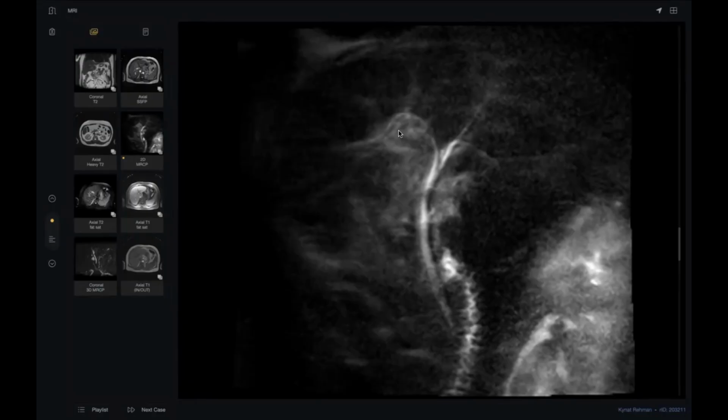Sir, because there are biliary channels, so there is delayed excretion in the cholangios. First, the liver will take up the contrast, and then. Okay, but because it is hypovascular, very easy. Yes, sir. Hypovascular. Any hypovascular lesion. And I think in cholangiocarcinoma, when it causes retraction, it indicates that it has some fibrous stroma. Overall, the cholangiocarcinoma is hypovascular, at least in relation to the nearby liver parenchyma. Thank you, doctor.